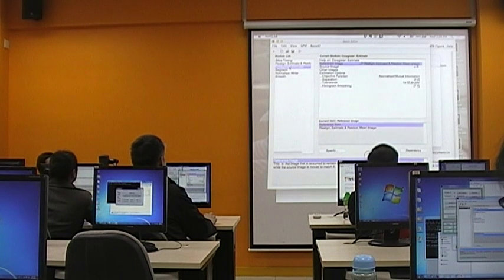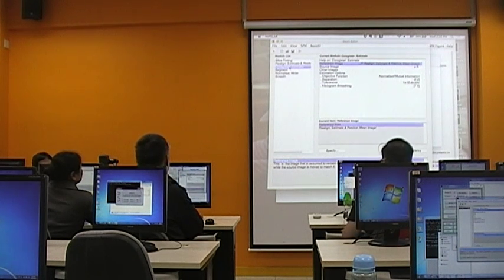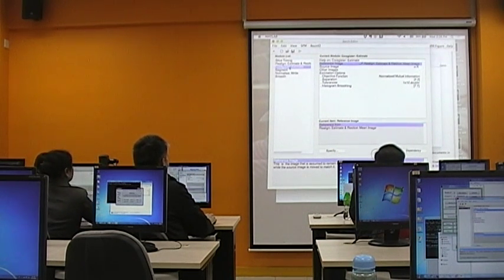So after movement correction, we obtain the mean image, then we want to bring the high resolution structural image together to the same space as the functional image. Now remember, after realignment, we have created the mean image, which is quite a nice representation of the anatomical details for the fMRI data. So we are using that as a reference, which means that during the process it remains stationary.